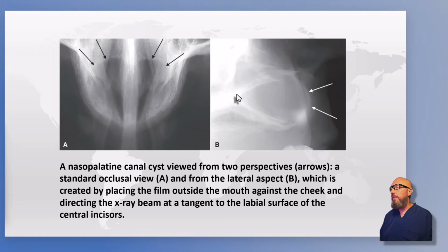Look how expansile this is. The nasal cavity gets pressed up like this. The hard palate line gets depressed inferiorly, but it maintains that nice cortical outline, really telling you that this is a well-behaving corticated benign lesion. It also shows a cortex from the periosteal reaction here.